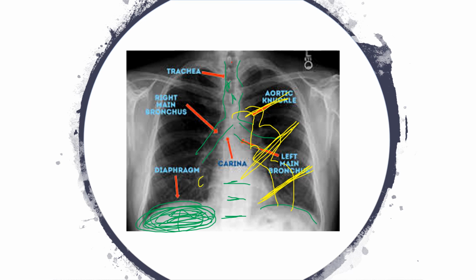This person has some air bronchograms. They have definitely some intrapulmonary conditions going on. These things that look like hoops in there, for sure. So just some basic things that you'll see here.